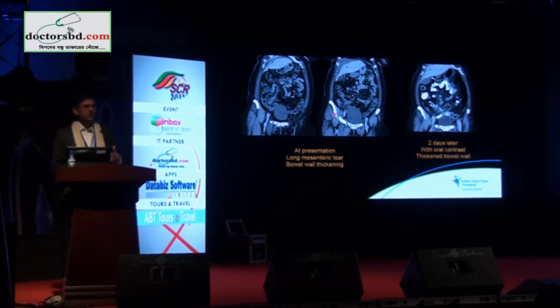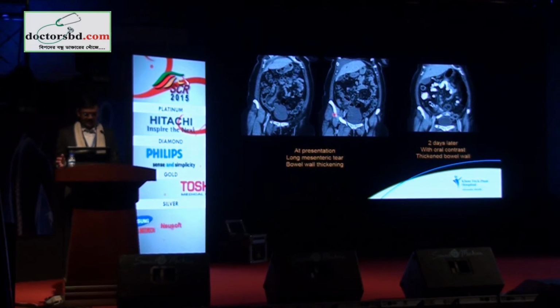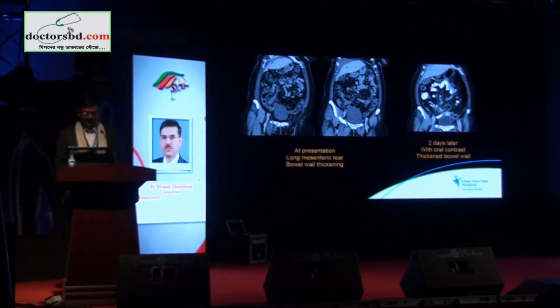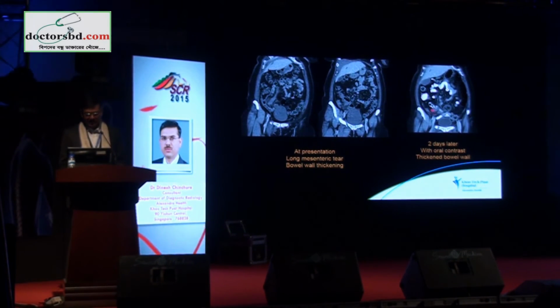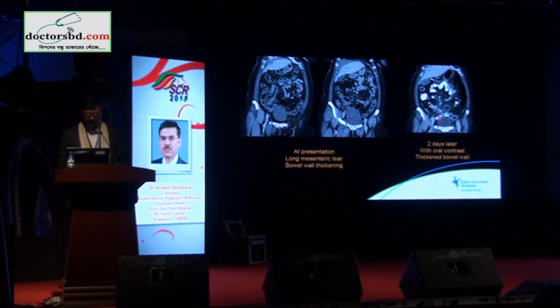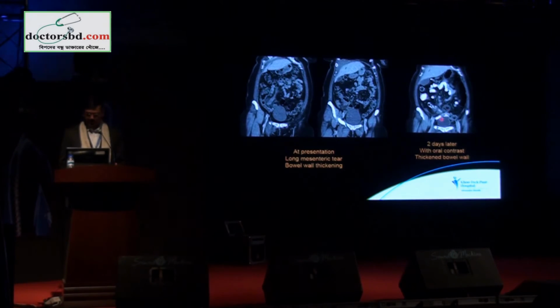At this point of time, the patient was doing well. The surgeon decided to manage conservatively, but 2 days later, the patient wasn't really recovering, and a repeat CT was done. So that's the value of having a repeat CT scan in these cases. And when you do a repeat CT scan, we can give oral contrast because we want to evaluate the bowel better. You can see that there is persistent bowel wall thickening. The patient wasn't really doing well, and this bowel loop was abnormal. There was perforation on surgery, although there was no leak of contrast.